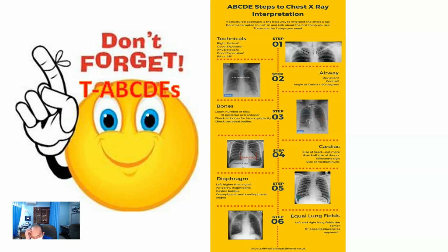So in order to read and not miss anything in chest X-ray interpretation, we do not forget about T, A, B, C, D, E, S.